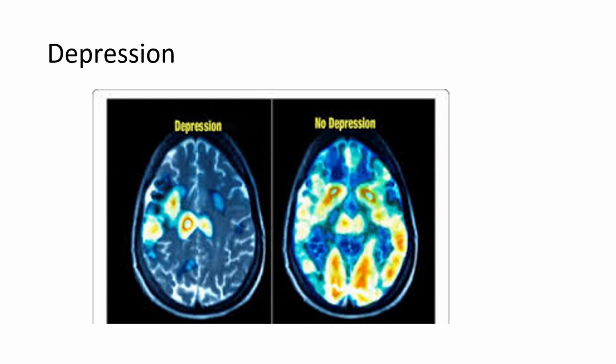And now moving on to depression. This is depression imaging, or PET imaging that's fused with MRI. And you'll notice with depression that there is just global hypoperfusion, just like the depression I showed you on the last one with the patient that had bipolar disorder. You just see this global hypometabolism of FDG.